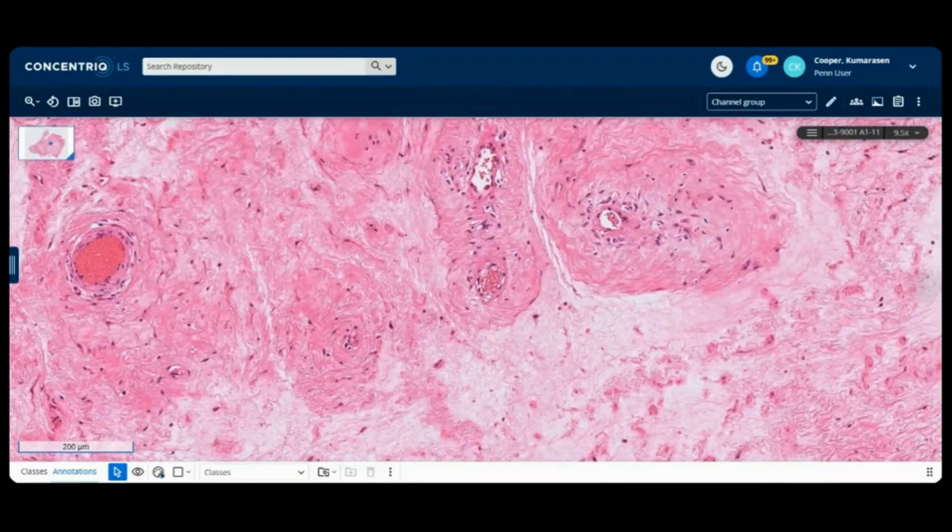Omar wants an SMA, S100, ERG. He's not telling us why he wants that. So a little cryptic, but there is some SMA immunoreactivity, but not that much. S100 is negative. ERG, of course, is going to highlight the endothelial cells of the blood vessels. So the stromal cells are S100 negative. And I think for discussion purposes, Omar, let's say that the SMA is negative for now. It's an important thought that you bring into the conversation, a myoid component, but I won't say more. Let the others have a go as well, right?